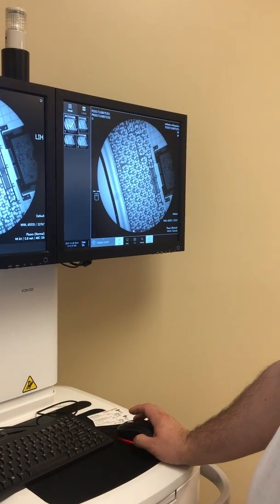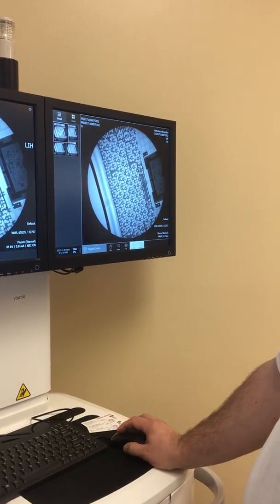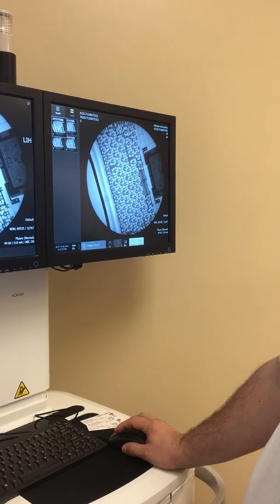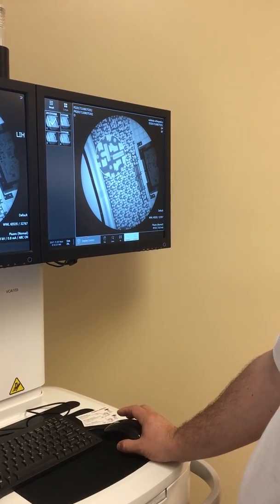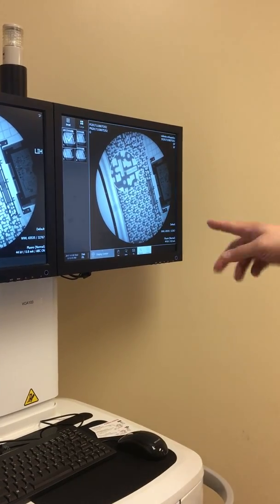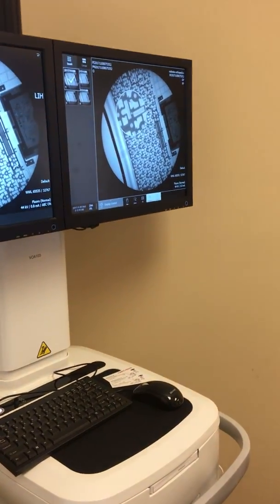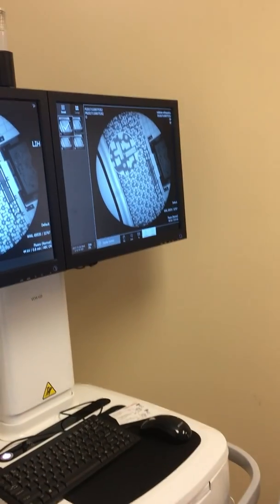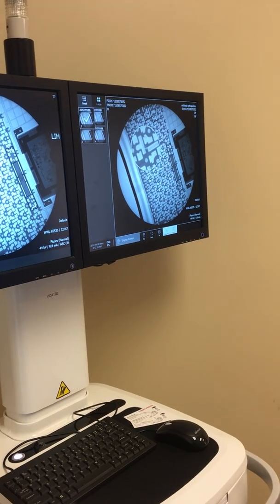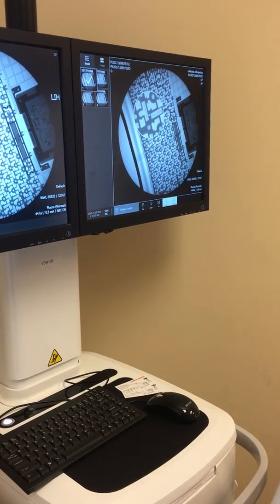Okay, hit fit, it'll resize it. Magnifier. You can turn the overlay on and off. Okay. Magnifier's kind of nice, like when he's squinting and staring at the screen. Yeah, I mean, on occasion, some of these functions might actually be used. Right. A lot of them are kind of excessive, especially for normal pain management type procedures. They're nice to have. They're easy for the software engineers to implement into the software, but they may not necessarily be all that useful on a day-to-day basis.